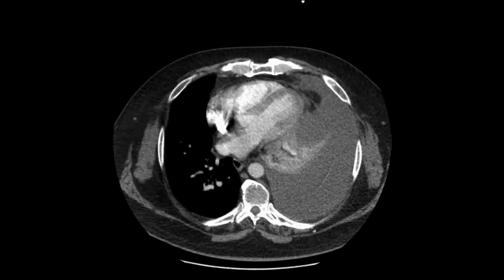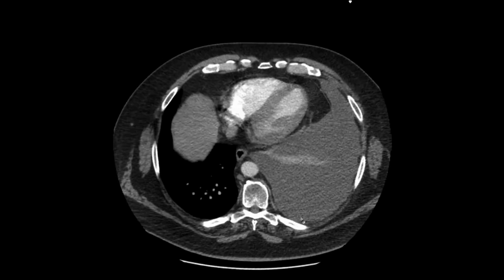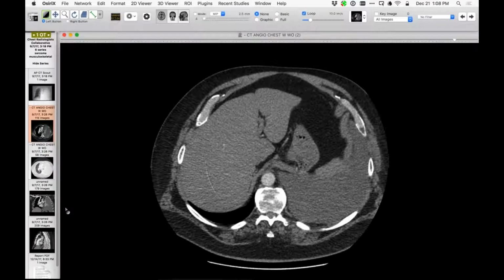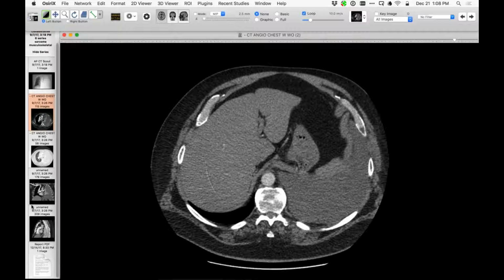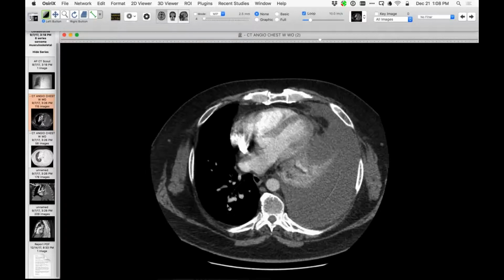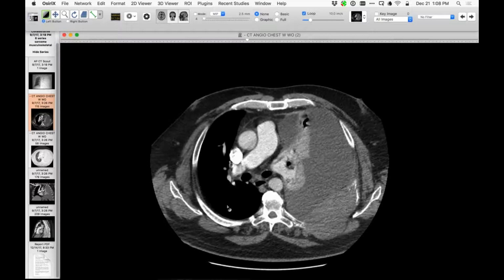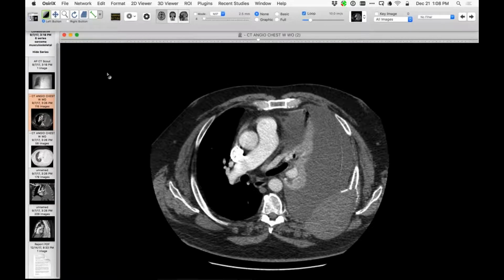And the follow-up, which I thought I had findings in the basal hemithorax with, I thought, a little bit of ossified matrix, very suggestive of growing pleural implants of tumor, but I thought I had that, but I don't. This is a telangiectatic osteosarcoma, undoubtedly arising in that rib. A pretty nasty tumor, of course.